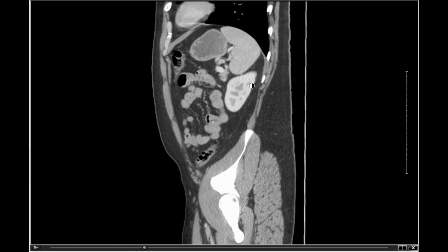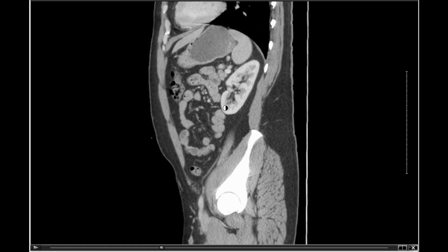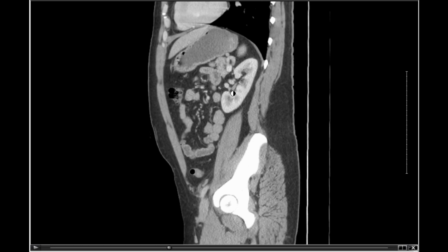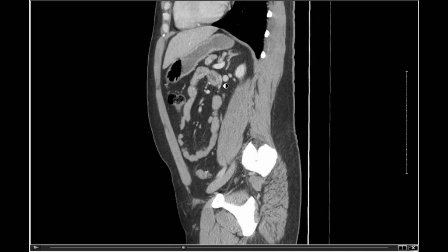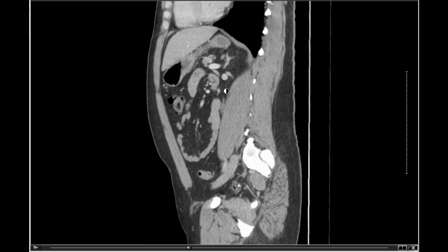So we'll roll a little further in, and we can actually make out in white the cortex, a little bit darker medulla, and the very dark spaces are the urinary spaces. So here we can see that. The ureter is a little bit tough to spot here, so let me see if we can catch it. Right here we can see the renal artery or vein. Can't tell which one's which, but they're both there, leaving to attach to the inferior vena cava and aorta.